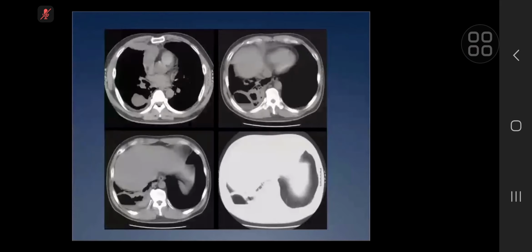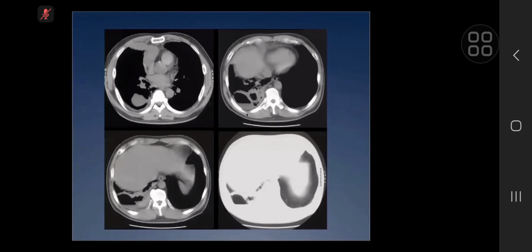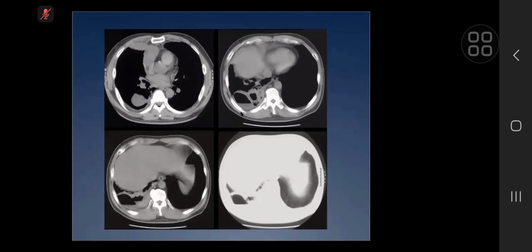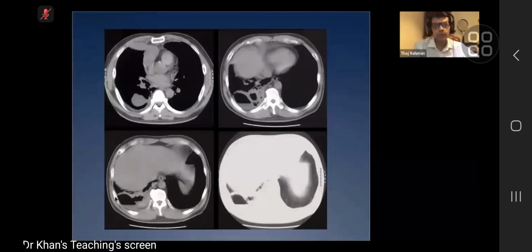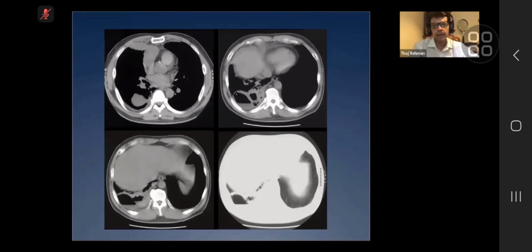Yes. Okay. So, do you want to comment on the CT? Can you identify the corresponding air fluid level that you saw on X-ray? Can you see that on CT? Yes, there is an elliptical separation of the right basal pleura with fluid level and overlying consolidation. So what is this now? What's the pathological term for that? It's an encysted empyema. Yeah, it's an empyema, because that's in the pleural space now.